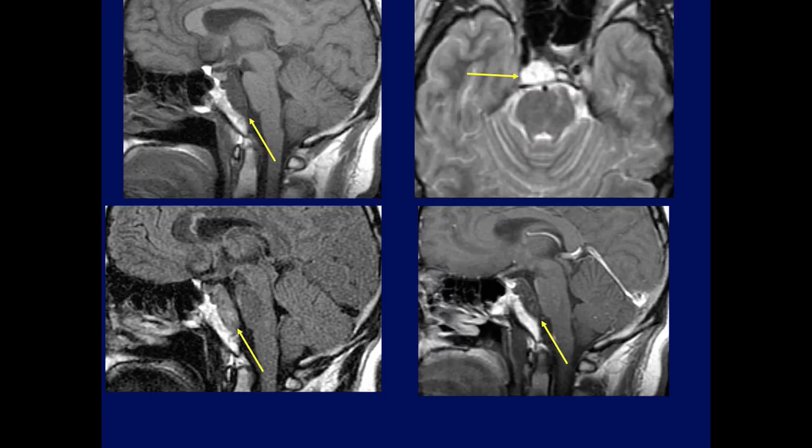What are we dealing with here? Another non-meningioma type lesion. Correct. Gino already has the diagnosis. Anybody else want to volunteer a diagnosis?